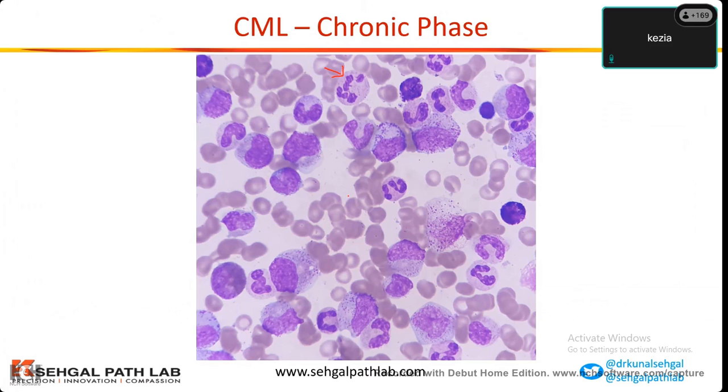Okay, I'm going to point out one cell and you have to tell me. Okay, step by step. Okay. So Dr. Akash, what is this cell? Lymphocyte, sir. Excellent. Okay. Dr. Sudeshna, can you tell me what is this cell? So band form, or a metamyelocyte going to a band form. You're correct. Similar one is over here. Then Dr. Swarupa, can you tell me what is this cell?